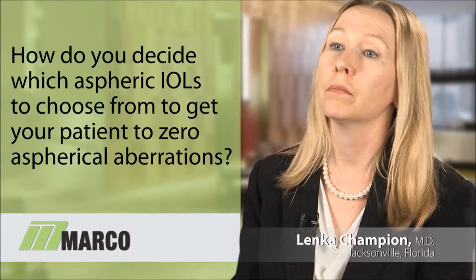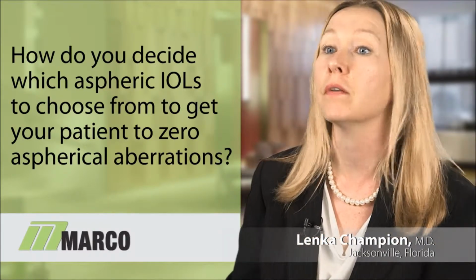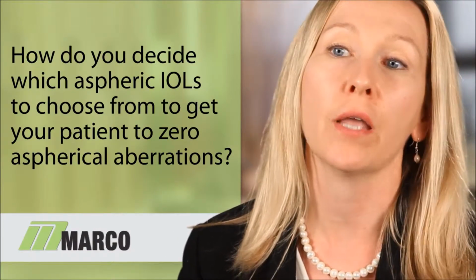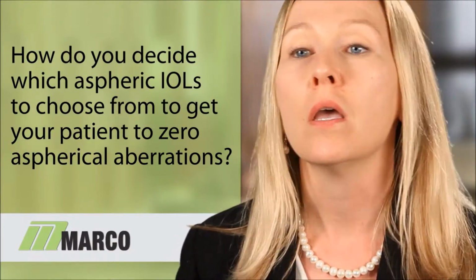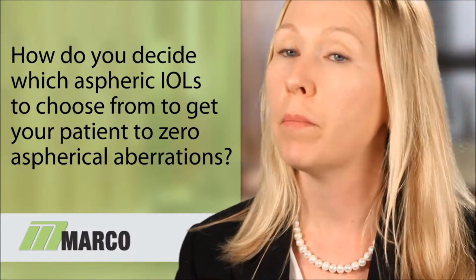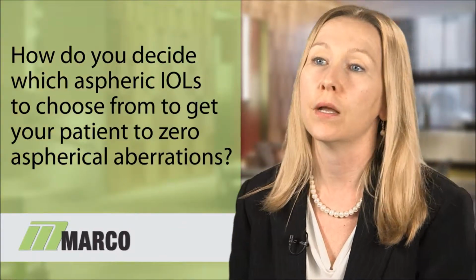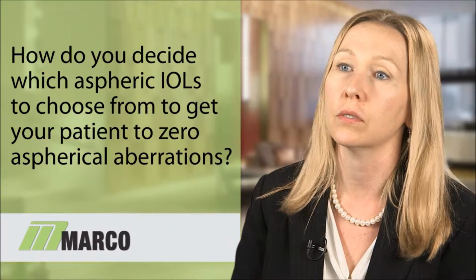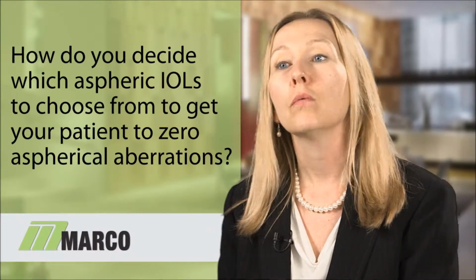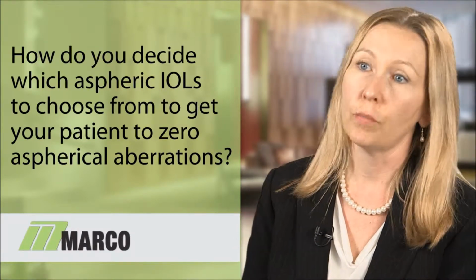The asphericity is a very important concept, and we're just beginning to understand the significance of it. We know that a negative spherical aberration actually adds to the depth of focus for patients and increases their ability to be able to see at near. We also know that positive spherical aberration is not good, and increasing that aberration can actually defocus patients and decrease their contrast sensitivity. In our practice, we use the OPD to customize the aspheric lens to each patient.